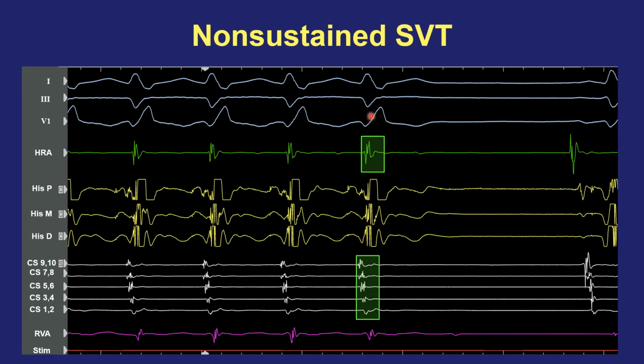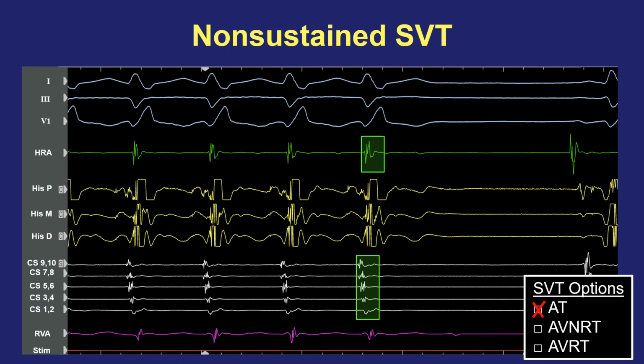So in fact, this V, this ventricular event, is generated from this A if this were an ATAC, in which case this A would go to nothing. So this actually is also ending with an A, even though the atrial event here is buried within the QRS and the QRS hangs past the atrial event, but still this technically is ending with an A. So if we put our checklist up, we can cross off atrial tachycardia for exactly the same reason that we crossed it off on the previous example. It ends with an A without this A being early. This isn't a PAC or something that is terminating an ATAC by coming in early. This is right on time and then terminating.